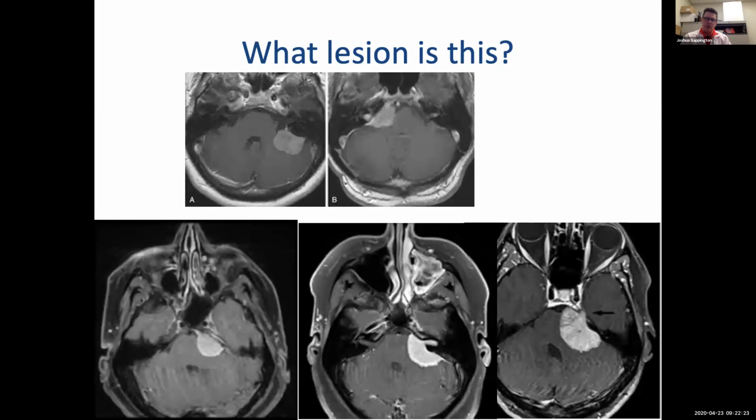You can have these very large meningiomas, and patients have really good hearing overall, and they keep their hearing for an extended period of time. One of the things that is very common for meningiomas is that they will have a dural tail, like right there. That will give it away. The other thing people will say is that they look like an umbrella. I always think they look like a shiitake mushroom, but then again, that may just be because I'm hungry.